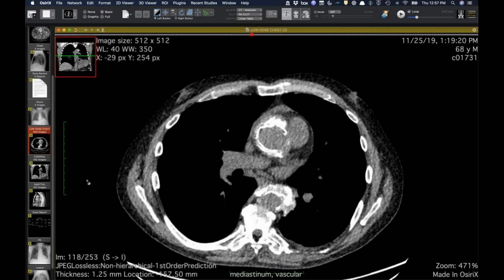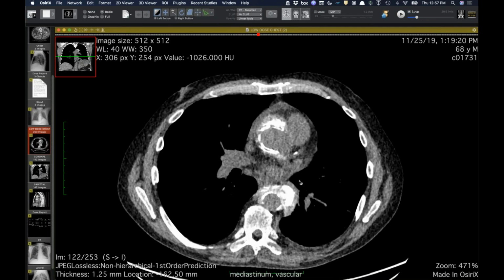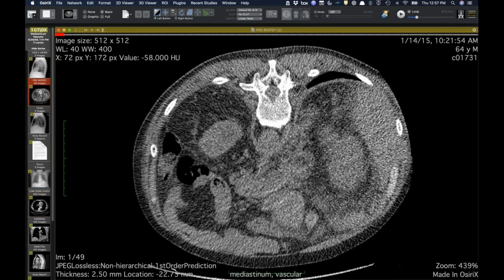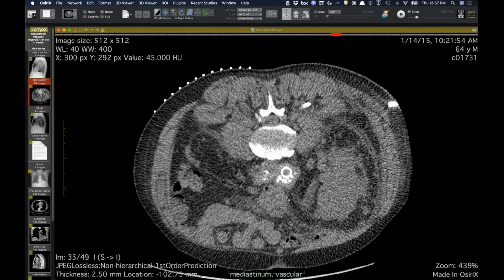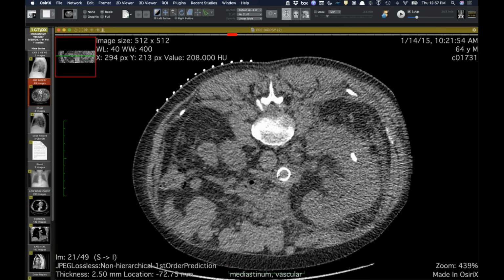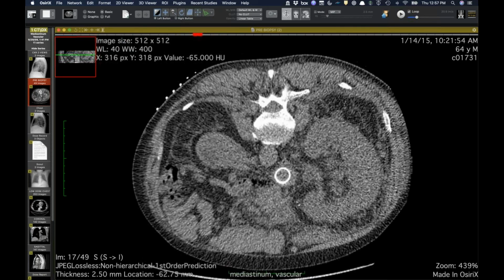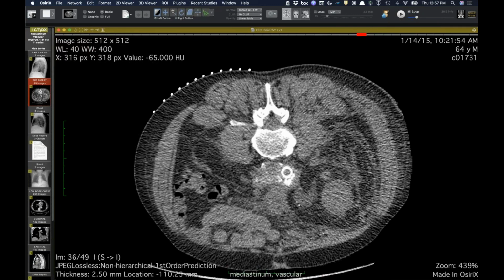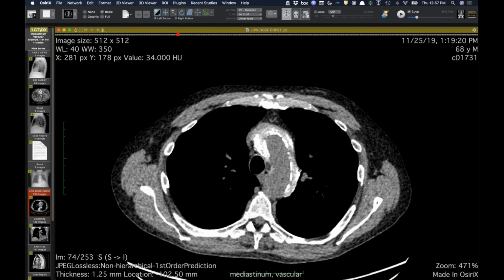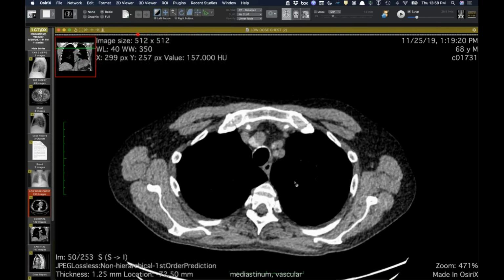And even if you just had the thoracic stuff, maybe some sort of burnout vasculitis like Takayasu, but the fact that he's had other systemic things, including all the retroperitoneal stuff, I mean, maybe some sort of granulomatous infection that caused a fibrosing mediastinitis type picture in his abdomen, a retroperitoneal fibrosis, but I don't know. I just thought I've never seen this kind of look encasing or surrounding the arch and the arch vessels. So I thought it was really interesting.